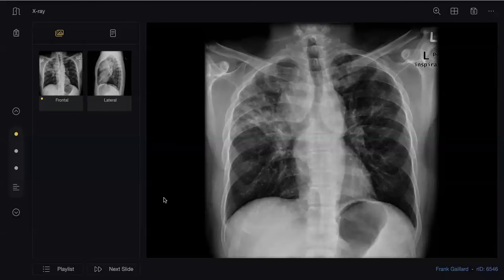Do you have any signs on X-ray related to sarcoidosis? The right paratracheal and bilateral lymphadenopathy. Just name the sign. It's a triple... I can't recall the name of the 1, 2, 3 sign. What about Garland triad? Yes, it's the same.